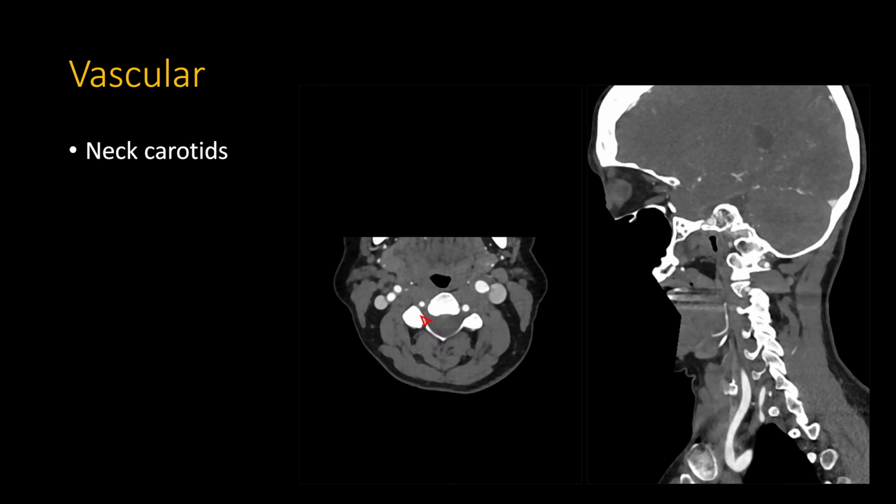If you don't really need to give a number, just a qualitative measurement will suffice. You can actually just measure the luminal diameter where it's narrowest. If that number happens to be 1.3 millimeters or lower, that roughly corresponds to severe stenosis. And if that number happens to be 2.2 millimeters or lower, that corresponds to moderate stenosis. And that's a relatively good one, and correlates nicely to catheter angiograms even.